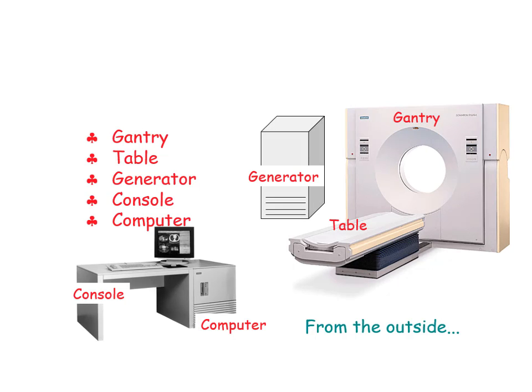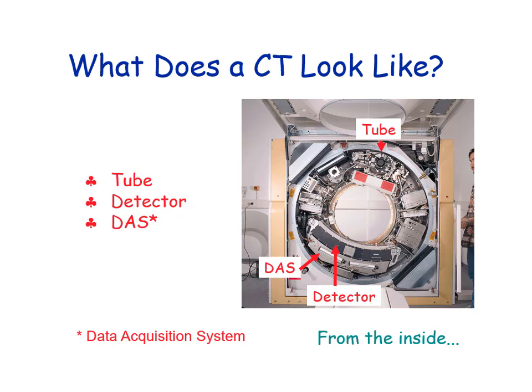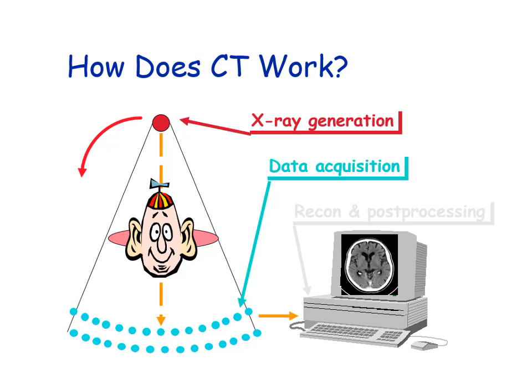Gantry. Table. Generator. Console. Computer. How does a CT look from the outside? And from the inside? Tube. Detector. DAS, the data acquisition system. Recon and post-processing. Data acquisition.